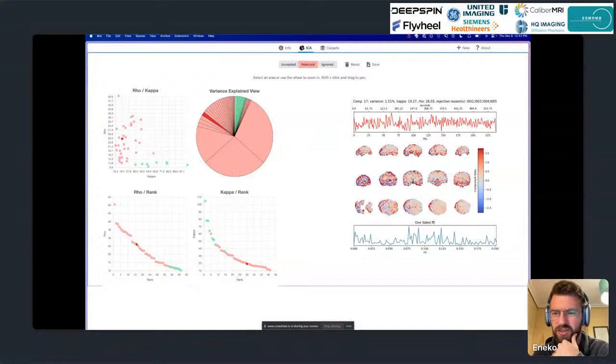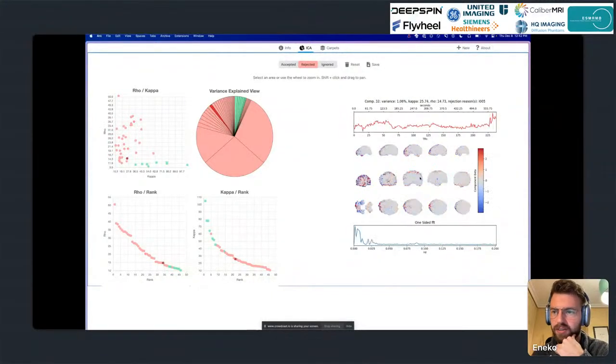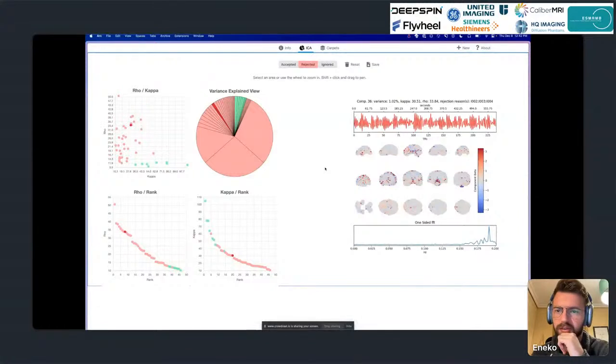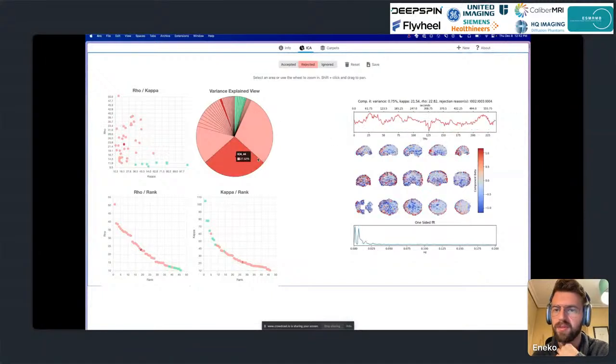Again, those patterns here are very high frequencies, slow drift with stripes. Again, this one's really all funny, what happens here at the end. Really high frequency, more stripes. The map here doesn't make much sense, and you can see kind of a sinusoidal pattern.